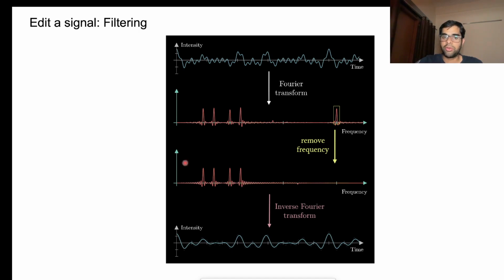Then what you do is you low pass the signal so that you have removed higher frequencies, and now you can comfortably downsample and still reconstruct the signal if your interest is not in the higher frequency signals. So that is one of the steps that we do before downsampling.